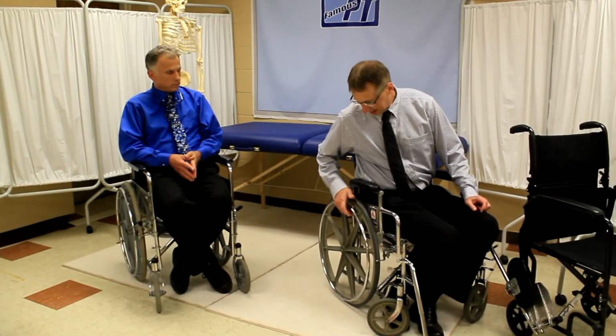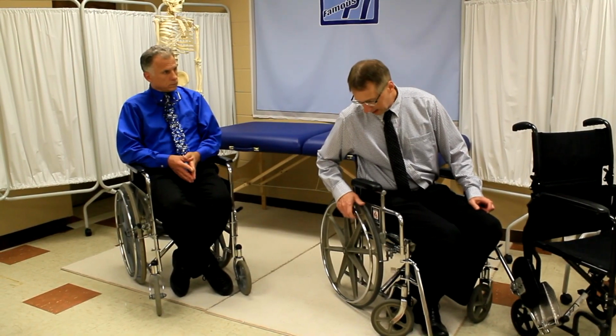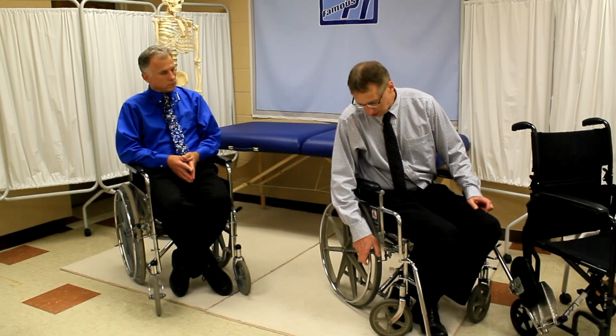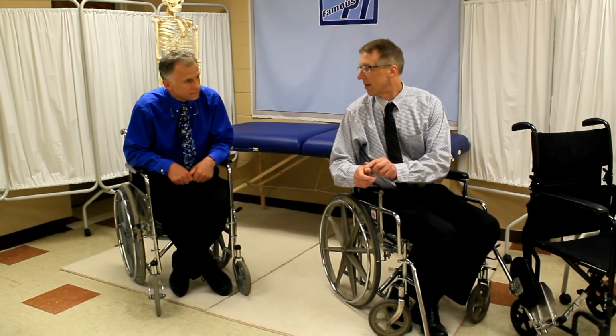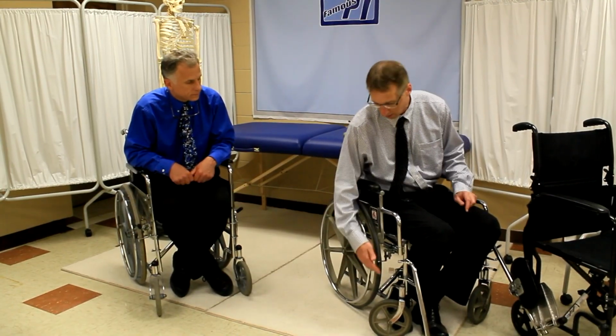I've done wheelchair sports, played wheelchair basketball, and a lot of times you'll grab onto the wheel and the rim, and what happens, you've got to watch, as you go down here, you hit the brake and you actually can cut your thumb. That's why you've seen on some people, the brakes are actually in the back or out of the way.